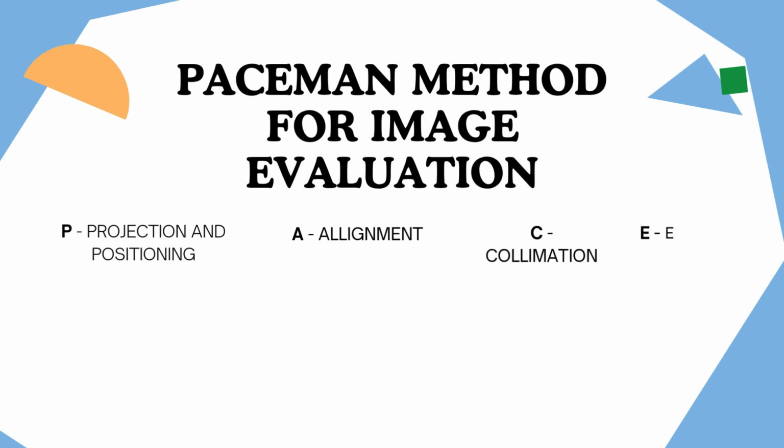Okay, now we move to the next part, which is the PACEMAN method for image evaluation. The PACEMAN method is a mnemonic used in radiology to assess the technical quality of radiographic images. It helps radiologists and other professionals evaluate whether an image meets the necessary standards for diagnosis.